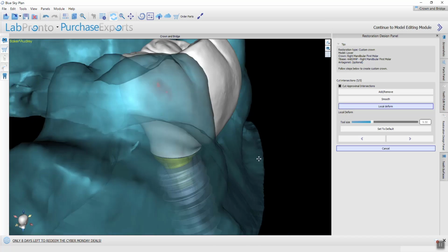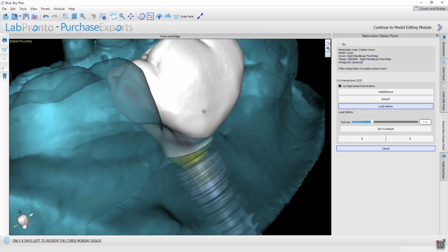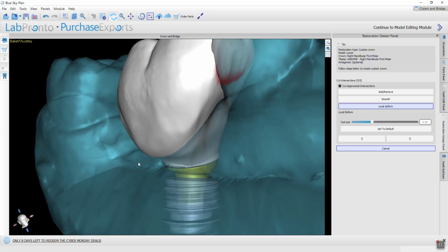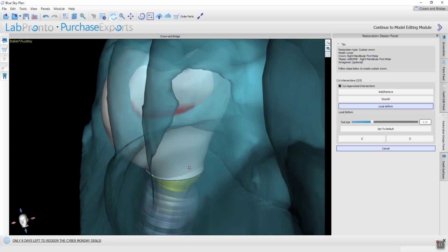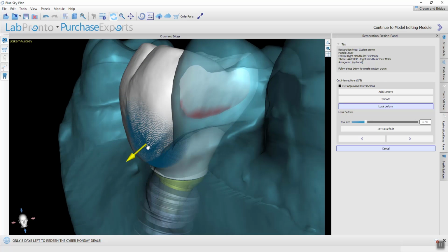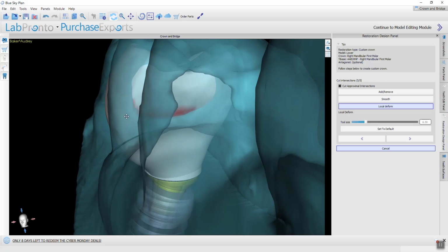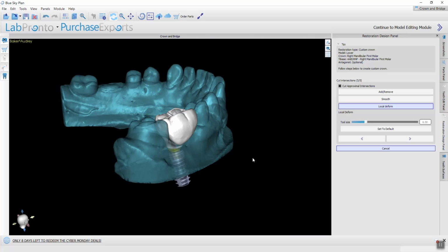So here you can just change your positions and make small changes. The big difference is when you make small changes, you can do this and change your perspective every single time that you make a small change. Okay, so you can have different perspectives and it will make your life easier this way. Okay, good.